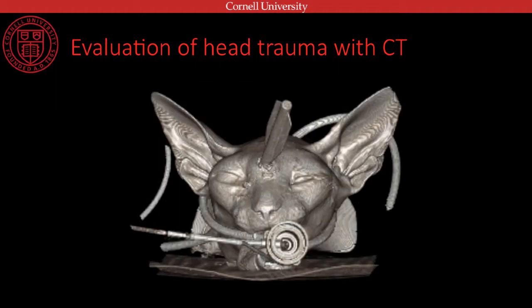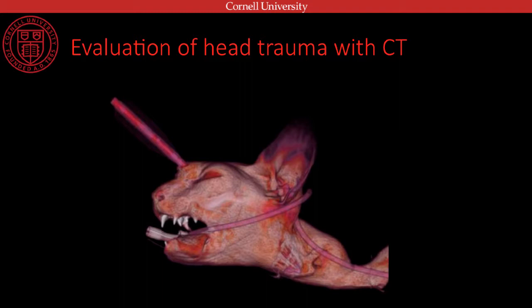This is her on CT reconstruction. So you can see where the head was sitting, and the tip is probably going to be sitting right in this level here, coming at this angle. And really we wanted to know: can we remove this arrow without causing significant hemorrhage or neurological deficits? And so we did some reconstructions to help show the surgeon exactly where it was lying.